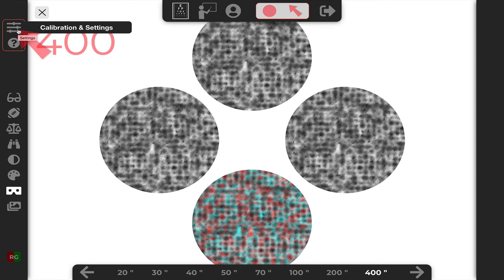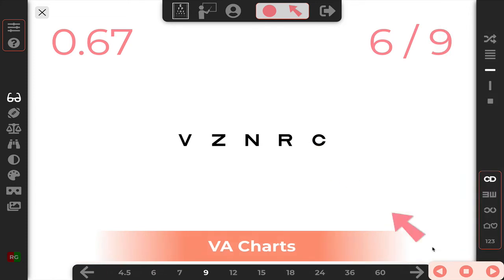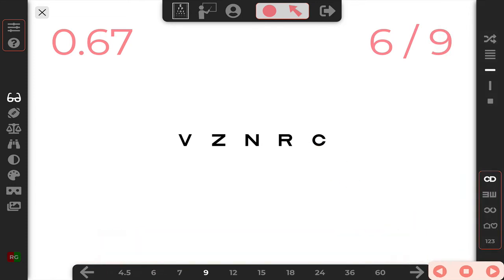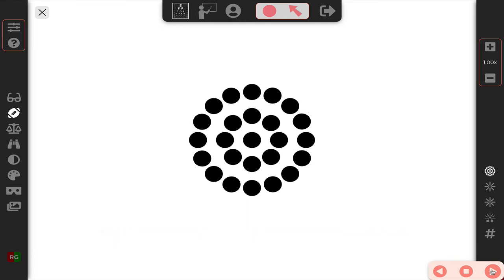So now if you go back here to your sequences, if you click on start, it'll start your sequence. You'll see it'll give you a little navigation menu down at the bottom. So this would be a stop, back and forward. So this would be the first step in our sequence, and then we can just step to the next one by clicking on the next button.